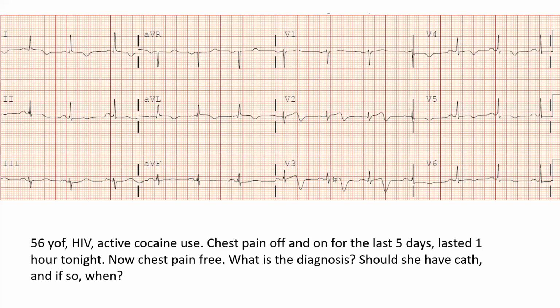You should not have Q waves as well. If you have ST elevation more than 1 millimeter or Q wave, then this is a STEMI. And actually, you can have the exact same morphology in a STEMI. Keep that in mind. We do not call it Wellens. So you can have a full-blown ST elevation that eventually progresses to this shape. This is not called Wellens. This is called STEMI. At one point in STEMI, you do evolve into a similar morphology of biphasic T then deep T inversion. It's not Wellens. It is a STEMI. Okay? So in this particular case, it's Wellens.